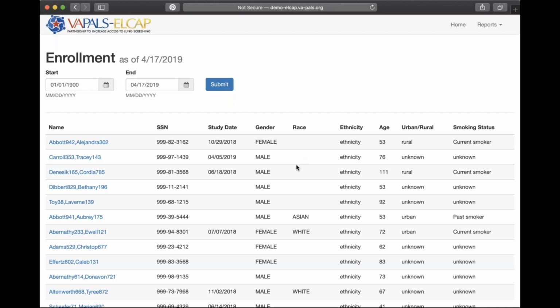And when you're in production, you probably would not have as many empty spaces because this is us playing around and leaving a lot of stuff that is not done that the nurse navigator would do because it's like, okay, I tested this thing. That's all I needed to do. I'm gone off to the next synthetic patient.